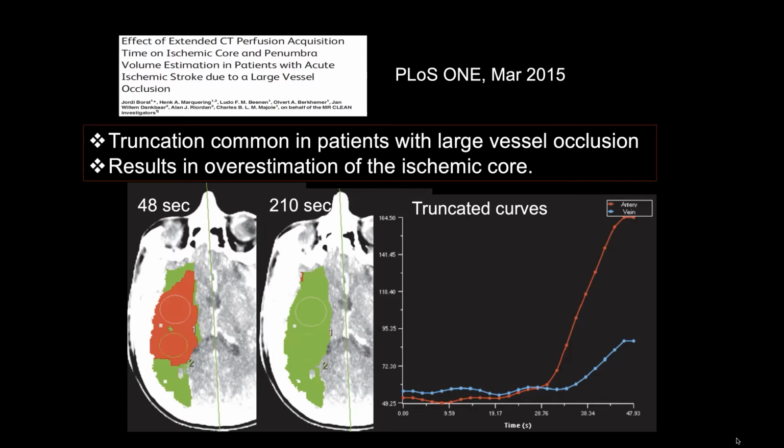And just to take you back to that earlier module, remember where we talked about CTP interpretation, and I talked about why the time density curve is so important. The time density curve is the basic thing that the software is going to look at. And in the background, your mathematical algorithms are using the time density curve to calculate everything else, right? So we want to make sure that the TDC is not suboptimal, rather it's adequate.